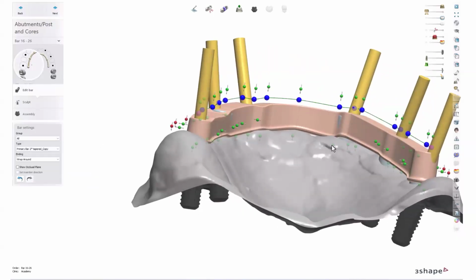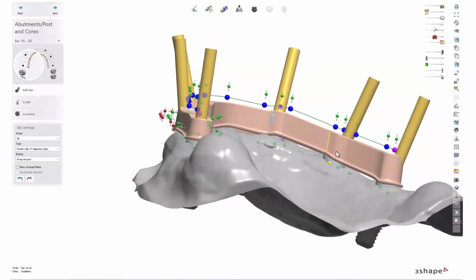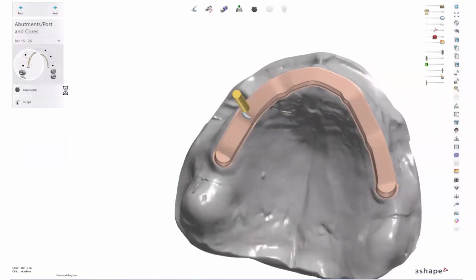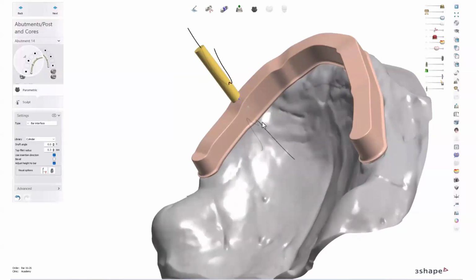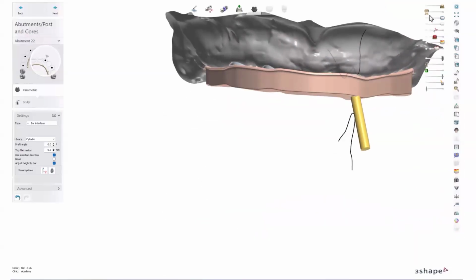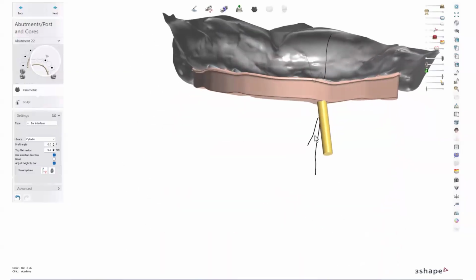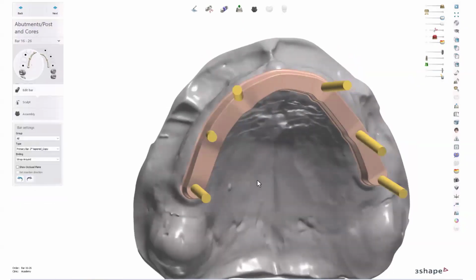So the reason why I've put this as a part of the video is so I can explain what's happening without, let's say, wasting too much time in the process. So once this part is done, I will also check that, like I said, components are not poking through, because that might cause the areas for where additional thickness will be needed, or drill compensation if we're going to be milling the secondary structure here.